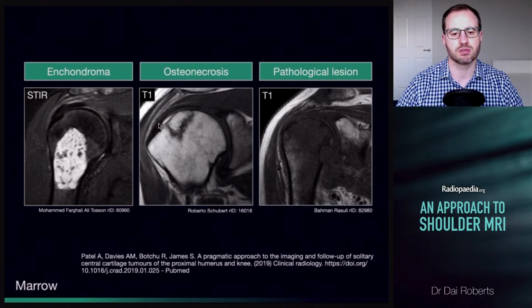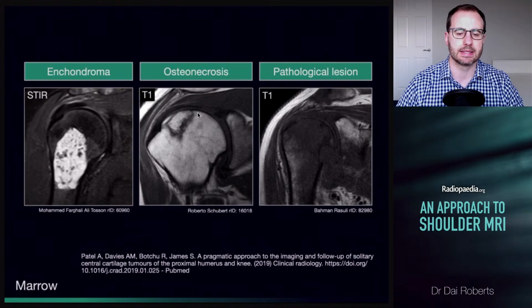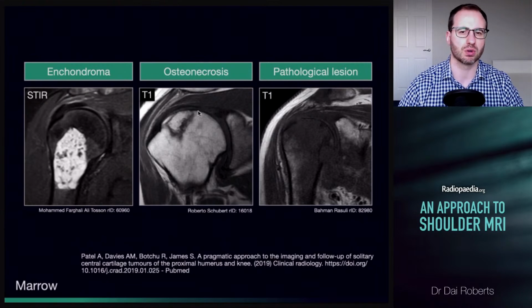And then osteonecrosis, previously known as AVN, is another thing which can occur in the proximal humerus. People on steroids, like those with SLE or Crohn's, this is an area where it can occur, along with the humeral heads, and you can see a double line sign on those T2 weighted sequences, and it usually occurs at this 10 o'clock to 2 o'clock position.